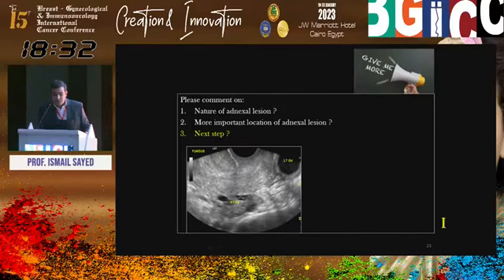Another case, this is sagittal view of the uterus. Look for this ovary. Normal appearing, but in abnormal location, posterior to the uterus. And now, what about the other ovary? Posterior and inferior. It is located behind the cervix, behind torus of the uterus, along the area of uterosacral ligament. I know it's in abnormal position, but it is not torsion. This cyst, low-level echoes, endometrioma.